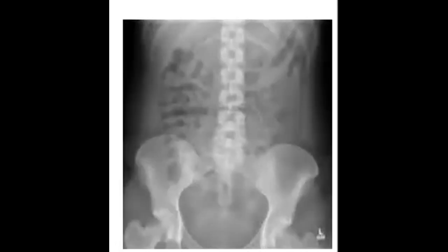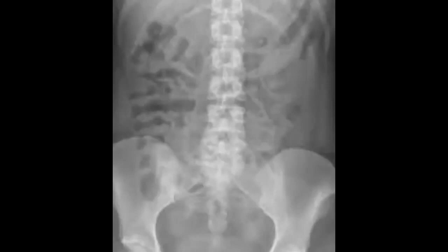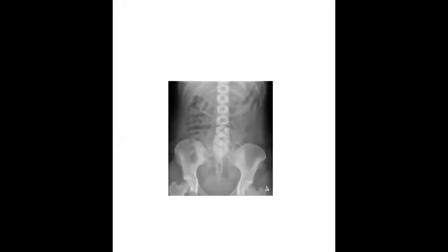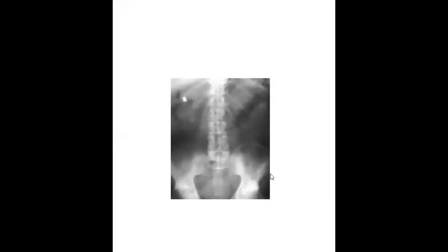Let's show you more. Thumb printing again. This one more obvious. Thumb printing.